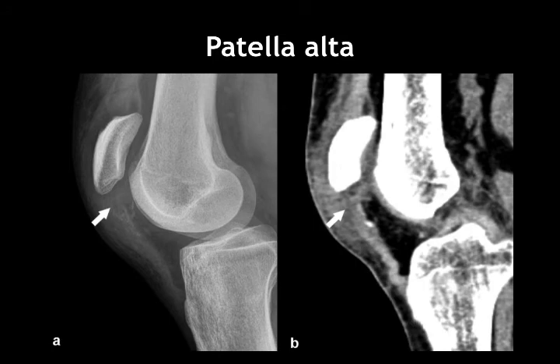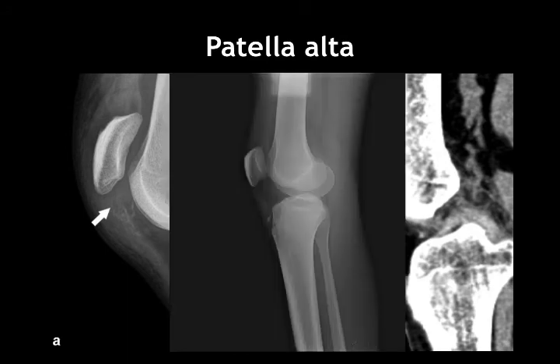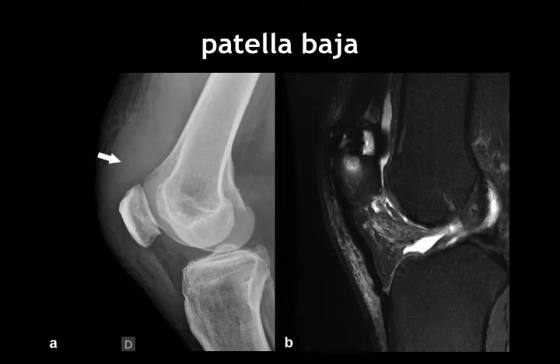The patella alta occurs when there is no support inferiorly to the patella, that is, if there is tear of the patellar tendon. So it is an indirect sign of injury to the patellar tendon, and we should always look for this sign in acute setting. Sometimes there may be avulsion fracture from the tibial tuberosity because of patellar tendon avulsion. Sometimes there may be patella baja because of injury to the quadriceps tendon, the patella lying inferiorly than its usual position.